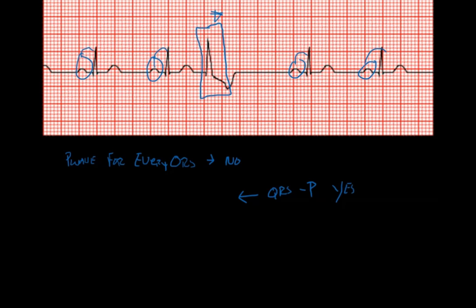And this is, again, don't jump ahead. Take your time. We're going to take a look at this, and we're going to start identifying what each one of these ECG rhythms are.